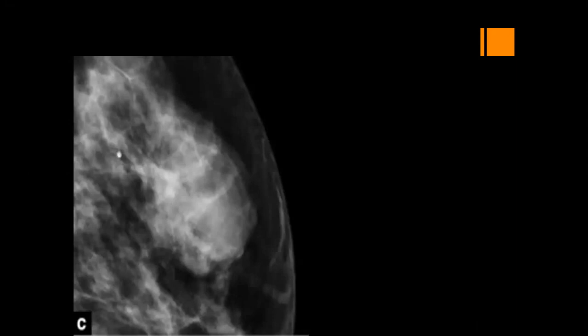It is not BI-RADS 2, it is not a fat containing lesion. Yes, there is fat density. Any fat containing lesion, you have to do BI-RADS 2.